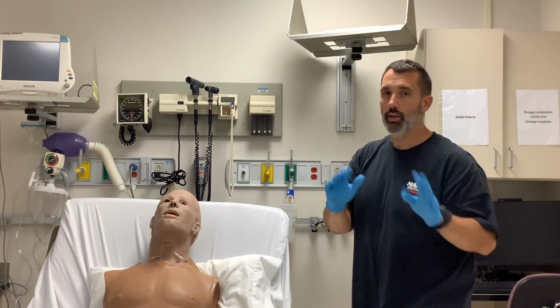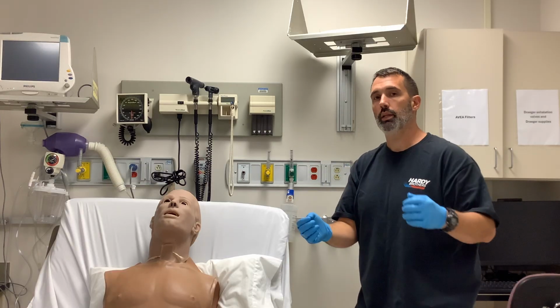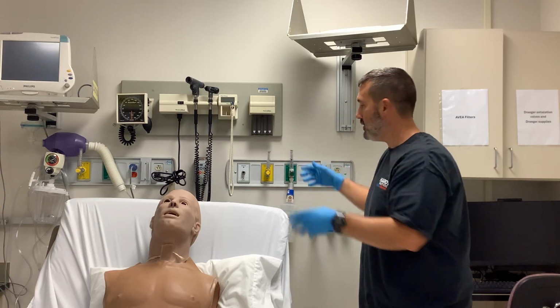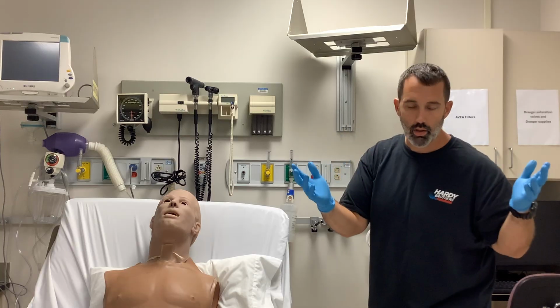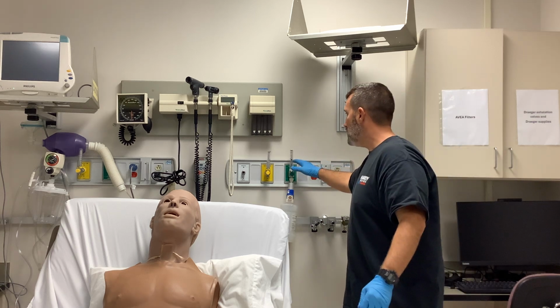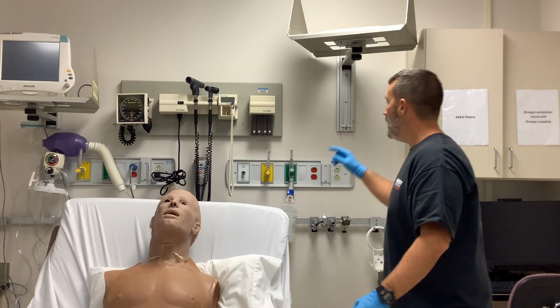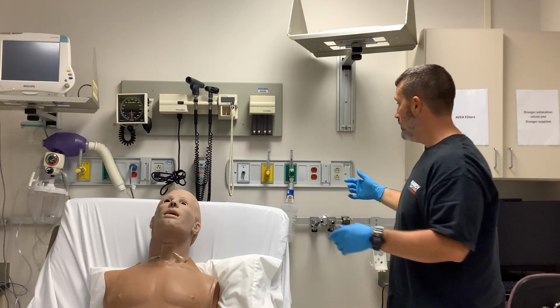So I know that you've got the nuts and bolts of your magic box, doing your air to oxygen entrainment ratios and actually working those out, but I wanted you to actually physically see it in action. So now, we'll stick with another setting. We'll do 60%. That's 1 to 1. I will not change the liter flow. So the liter flow will stay at 5 liters per minute. All I've got to do now is switch this collar to 60%.